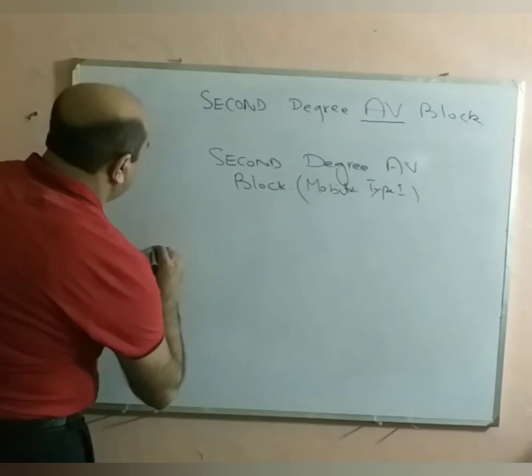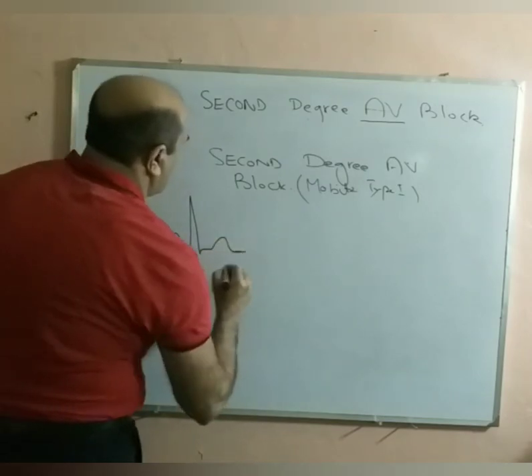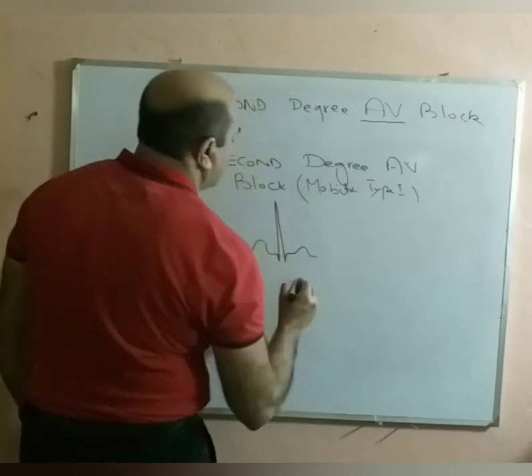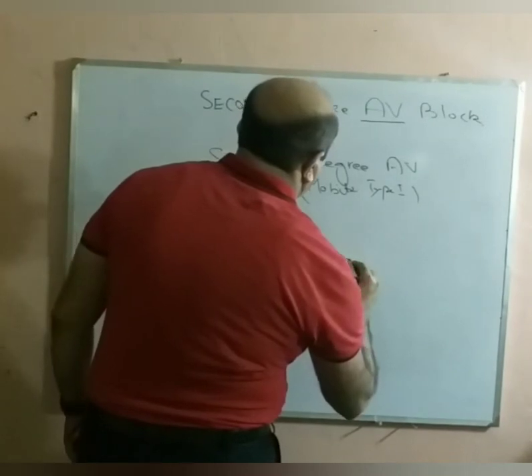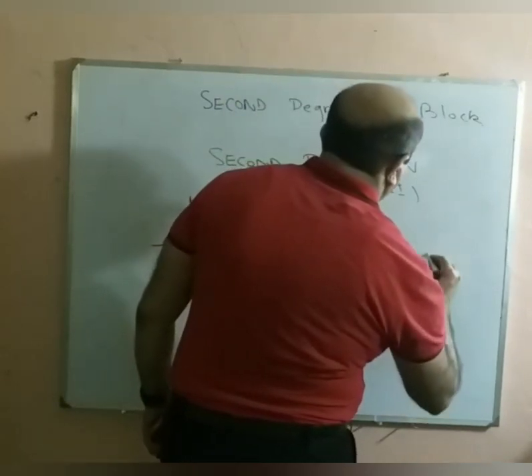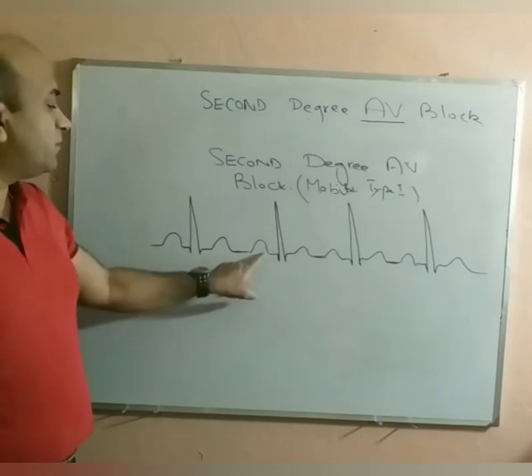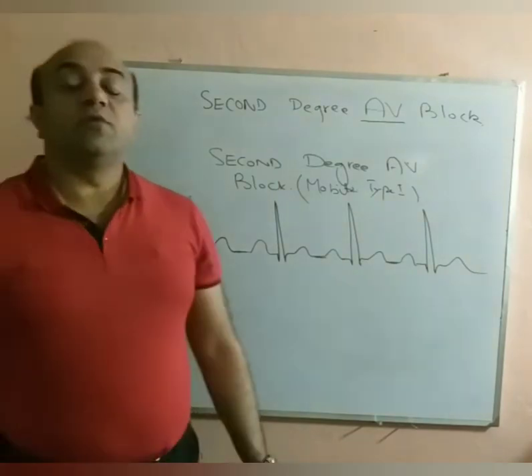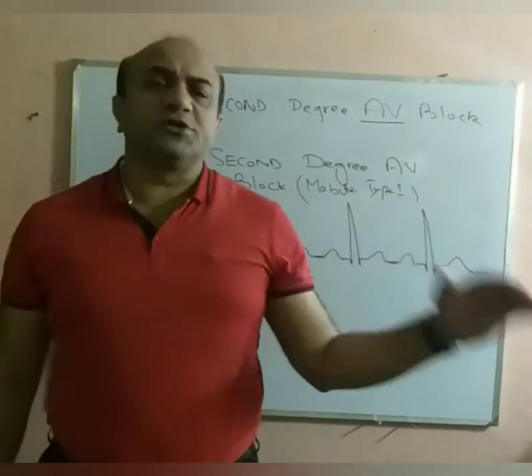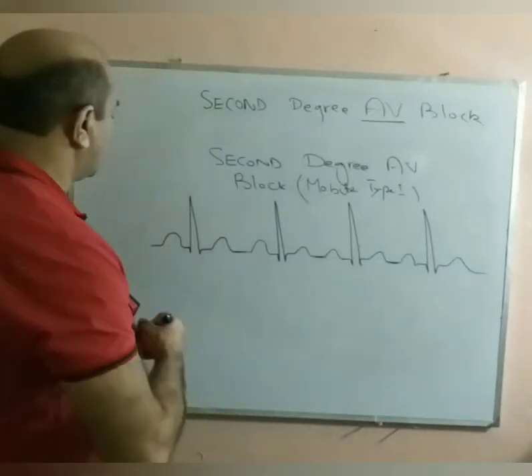If you look at this ECG, this is a normal ECG tracing where a P wave is present before each QRS complex. PR interval is less than one large box, or less than 5 small boxes, or less than 0.20 second, and it's a nice smooth tracing. Now let me draw another tracing and then I'll ask you, can you appreciate any difference between the two?